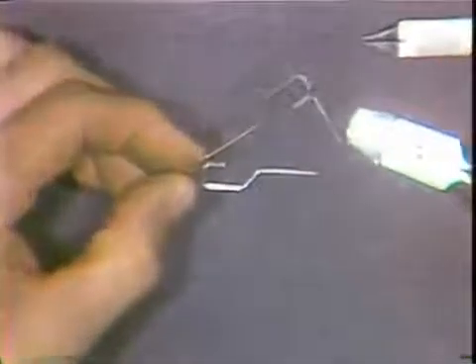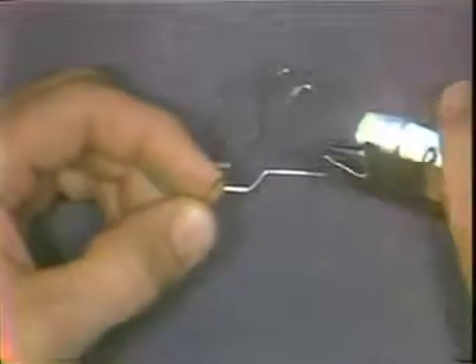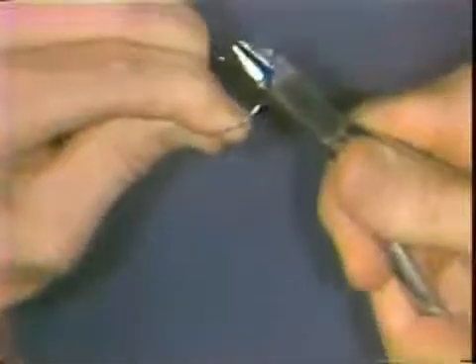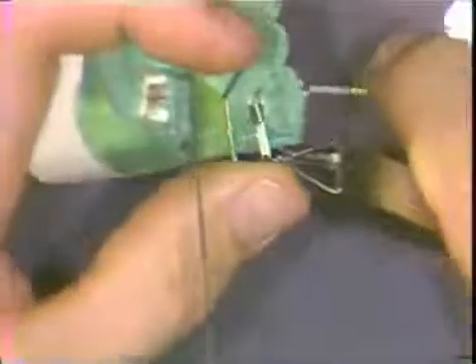At this point, the arch form is bent in to the anterior portion of the wire, and its first try is made onto the model. The wire is bent around the thumb and finger, and at this point the wire is tried into the model using plier force.